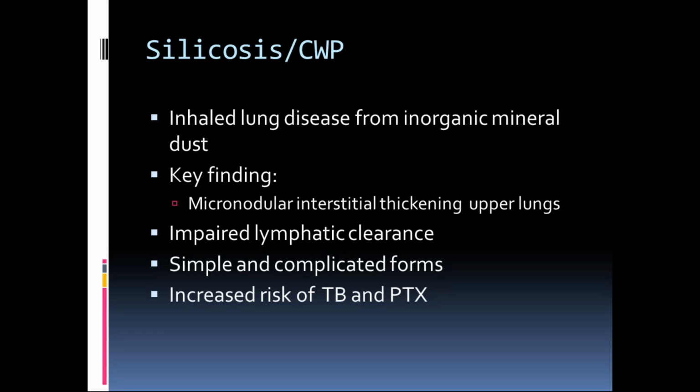They're lighter. So it's going to be in the upper lobes, and you're going to have impaired lymphatic clearance going on in the upper lobes to cause the abnormalities there. So it's going to be in a completely different zip code. You're still going to have some architectural changes. You're still going to have some calcification, but it's in a different zip code, is what I like to call it.